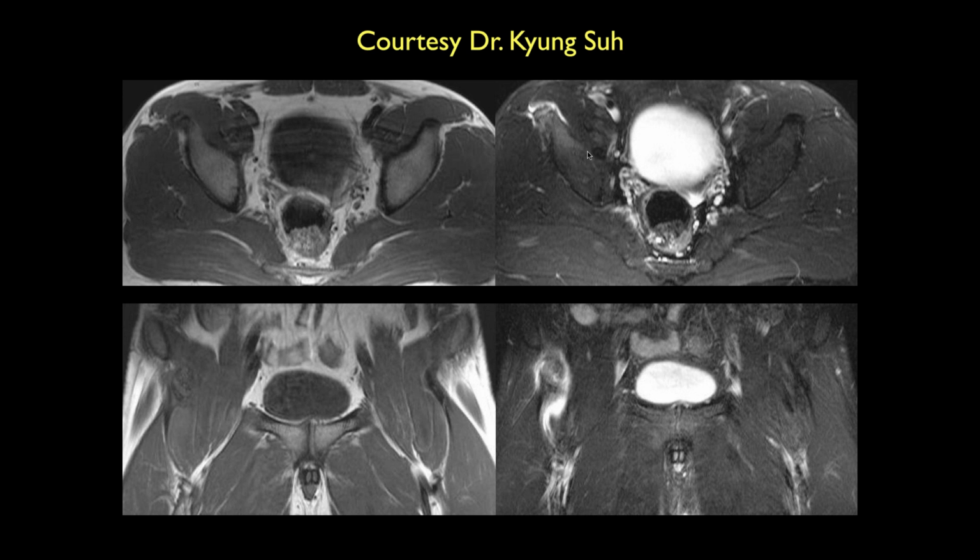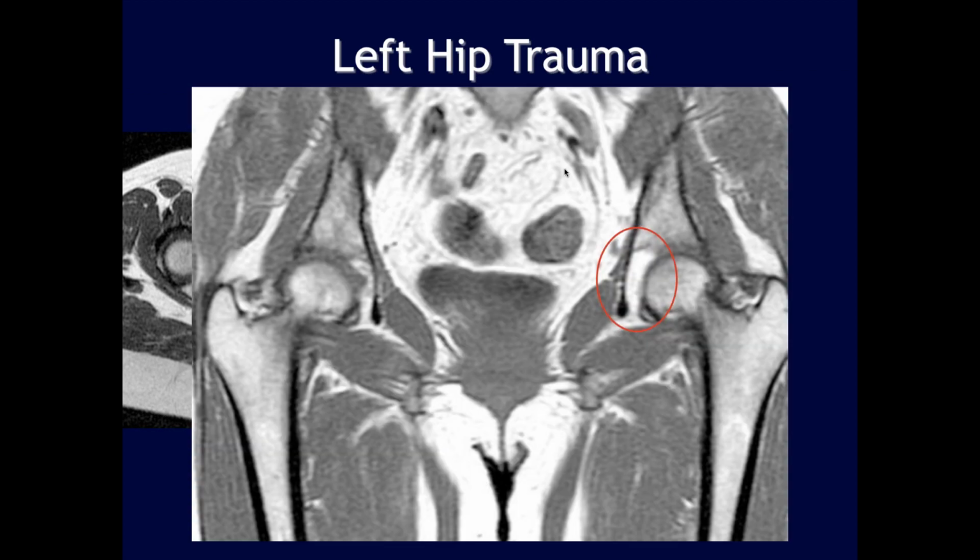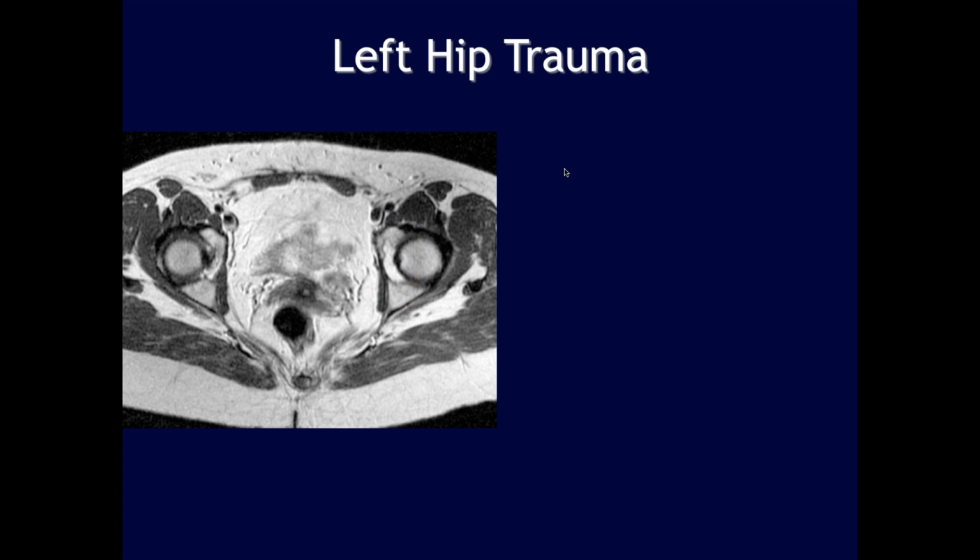Yeah, I think we're pretty low here. I think this is the top of the acetabulum here. The patient had... Oh, okay, so we're still at the rectus femoris then. Yeah, I think we're still at the rectus femoris. Well, I've got a lot more to talk about with rectus femoris insertion, but I guess that's later in this lecture. Okay.